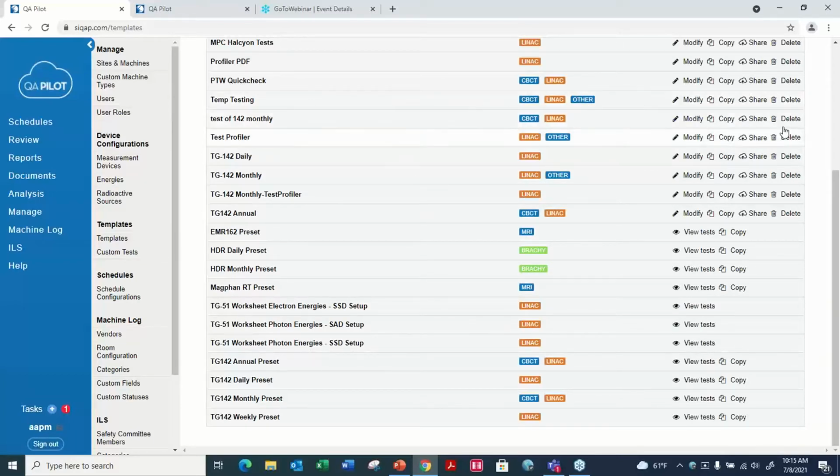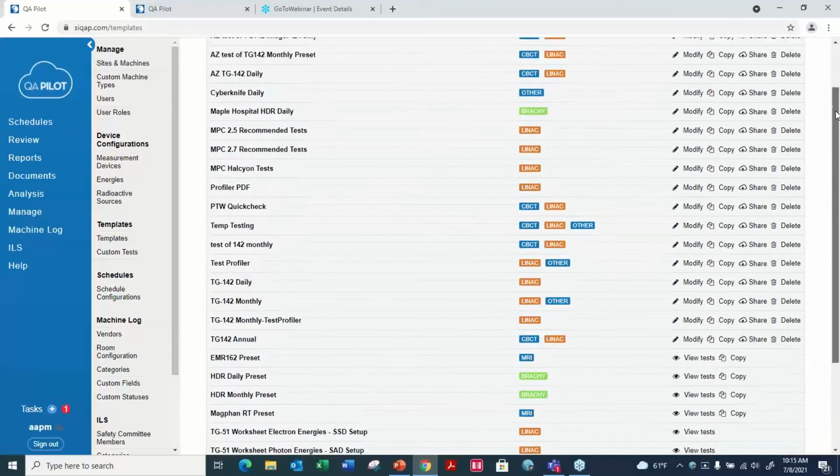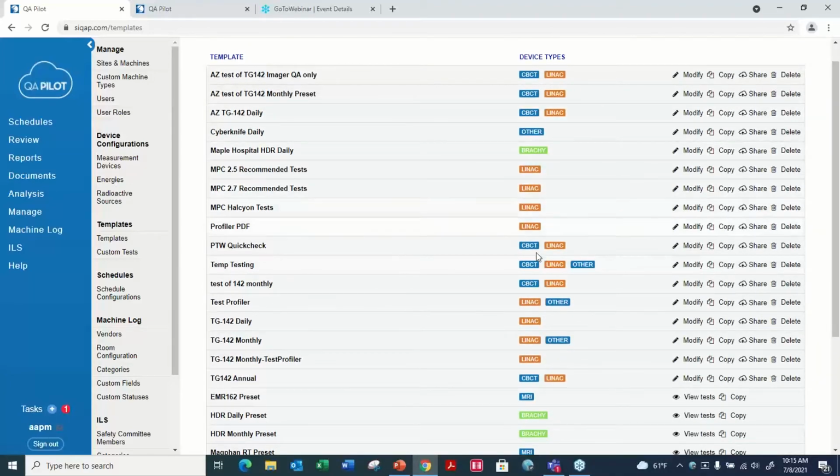which is, notice here that these are the device types, right? What type of Linac are we using? Does it have CBCT? Is it a Linac? Is it HDR? Like we've got Brachy and other. Well, we want to support, vendor neutrality doesn't just, it means more than Elekta versus Varian. It also means Accuray. It means proton systems. It means Gamma Knife systems. It means lots of different things, which we just categorize as other.